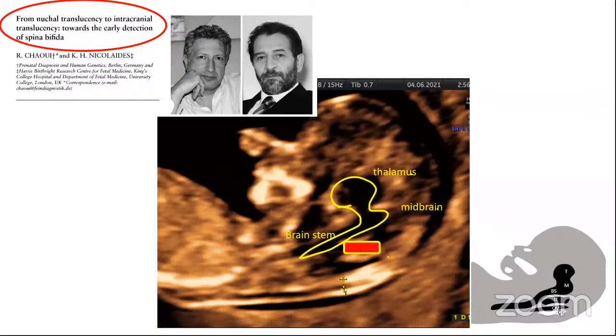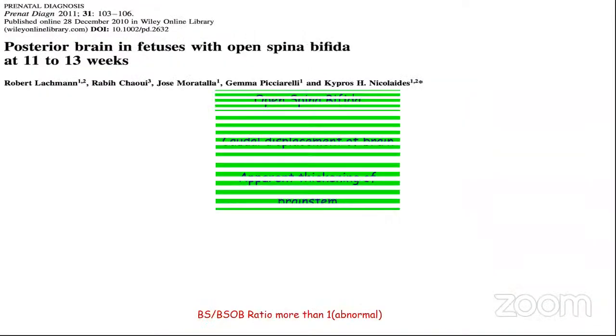And then the cystic structures are intracranial translucency, the cisterna magna, and the nuchal translucency. So we have to see in the mid-sagittal section of an NT image all these hypoechoic spaces, which are separated by 3 echogenic lines. And it was proposed that when there is open spina bifida, the caudal displacement of the brainstem leads to complete obliteration of the intracranial translucency and sometimes the cisterna magna. So this is a pointer towards open spina bifida, and it prompts us to go and look at the fetal spine in detail when we see such a finding on our routine NT image.